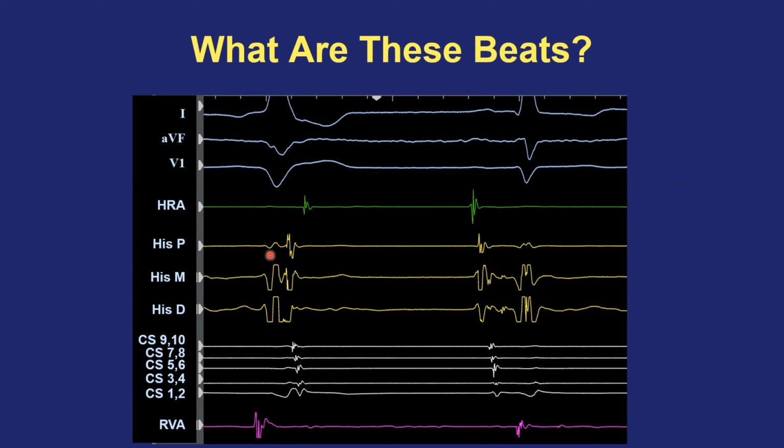So the ventricular electrograms happen first, and then that beat happens to conduct retrograde back up to the atrium through the His-Purkinje system, up through the AV node, and initially to the interatrial septum near the bundle of His recording, which is why the atrial signals in the His catheter happen first.